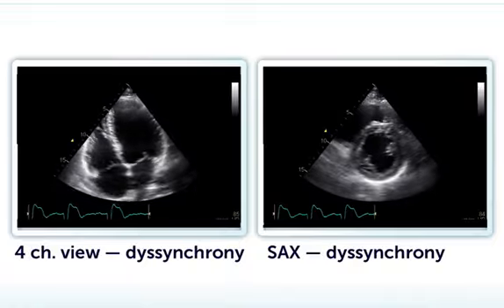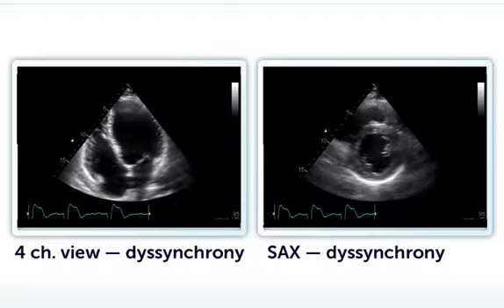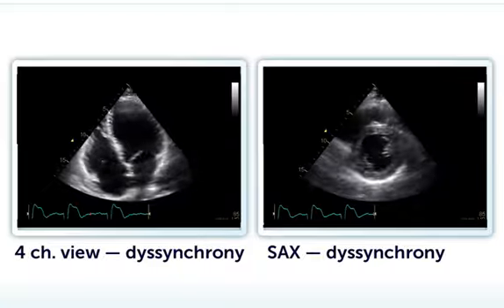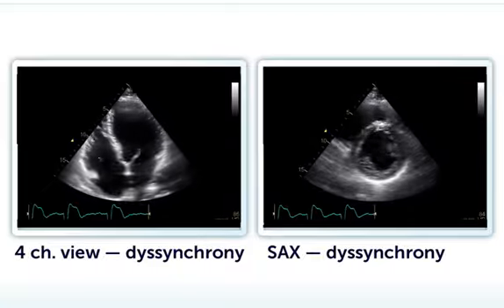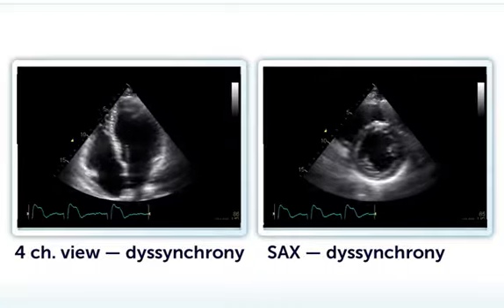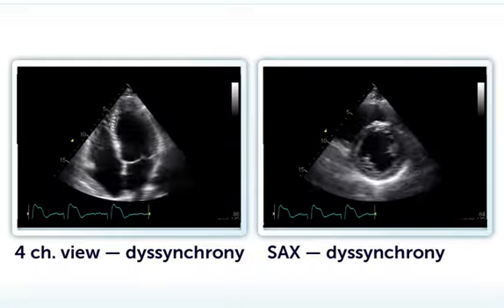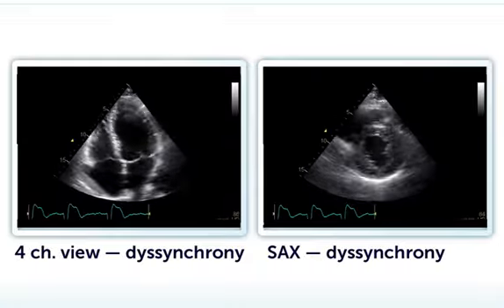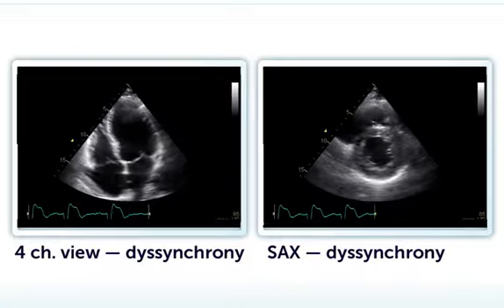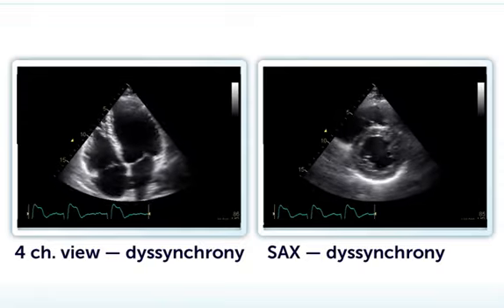Well, to give you the background, this is an echocardiogram of an athlete who was able to participate in a marathon. So the patient has normal left ventricular function even though it appears to be reduced. And this is very typical for left bundle branch block. Now, we do not know if left bundle branch block is in reality some expression of disease in this patient, or if left bundle branch block will sooner or later lead to myocardial disease in this patient. Nevertheless, keep in mind such patients always appear to have a worse left ventricular function than they actually do.